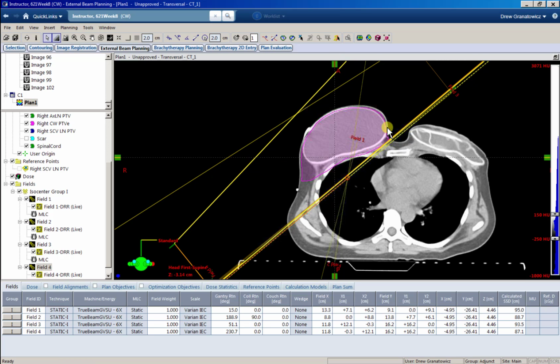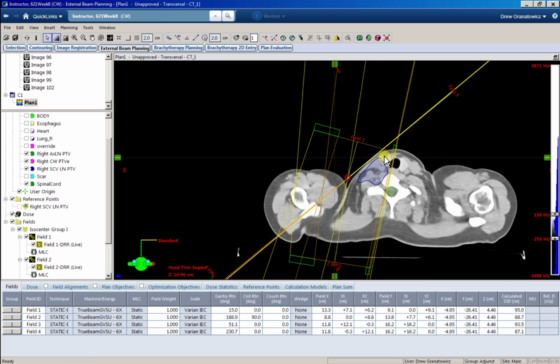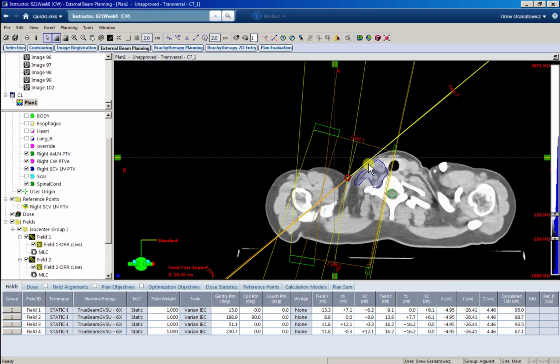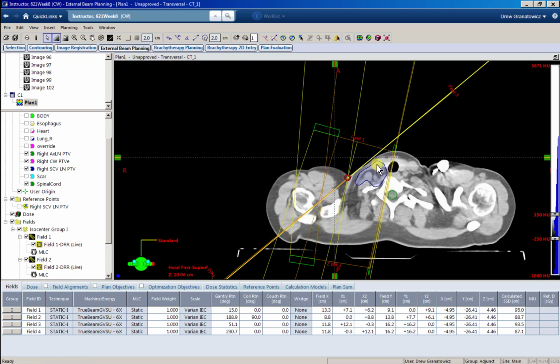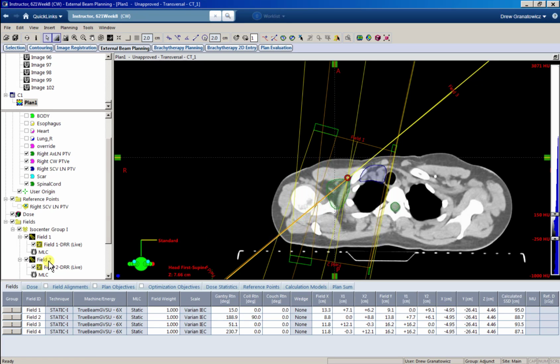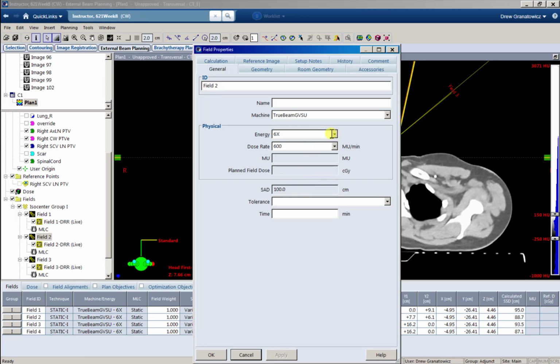So anyways, point is, this patient, the separation is only 20 anyways, so 6x is definitely all we're going to be thinking about there. If we come up here though and look at our nodes, the superclav nodes get fairly superficial up here, so we're going to definitely use 6x from the front side. But this back side, we have all this tissue to travel through from the back. So this posterior superclav / axilla field, we're going to make that 15x.